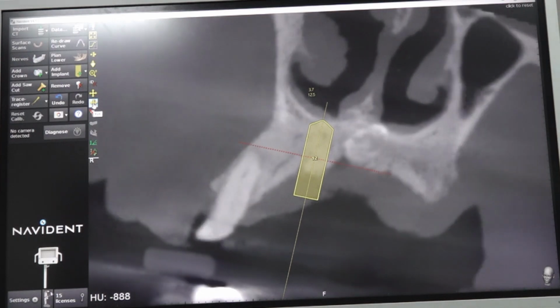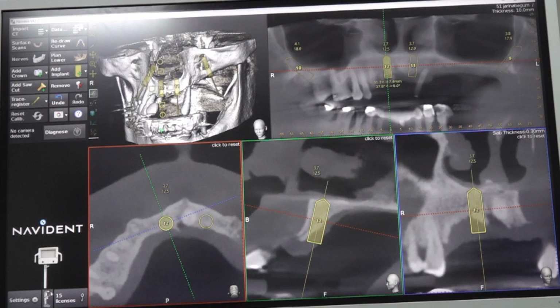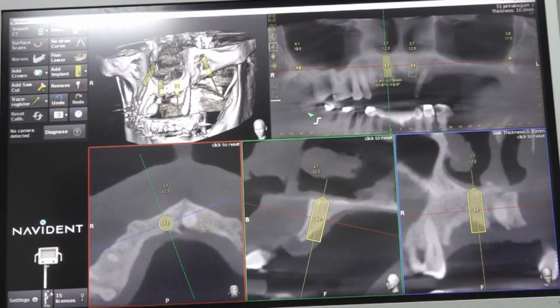Yeah, here also. If you see the mesiodens, the crown part is resorbed. The inside of the crown part is resorbed. This usually happens. Internal resorption. So 2 implants we can place with good stability. Here conventional implant is very challenging. Even with conventional implants they are doing a palatal approach, no? Same way. So these threads will be exposed and they will be covered by the palatal tissue.